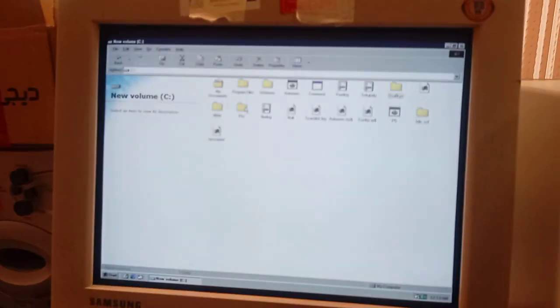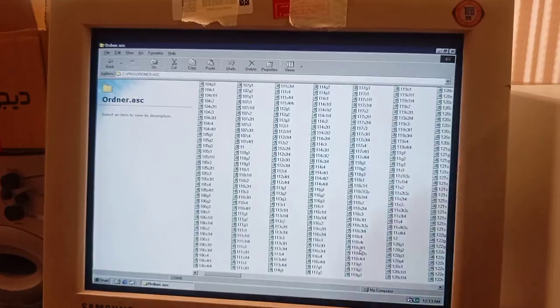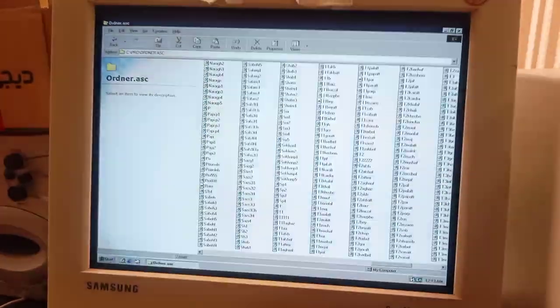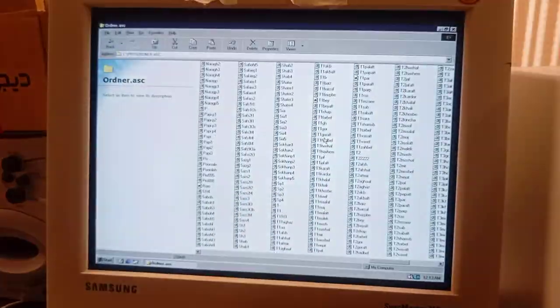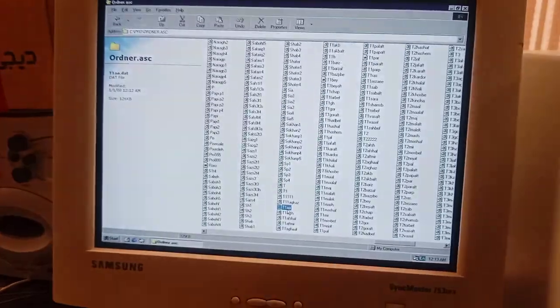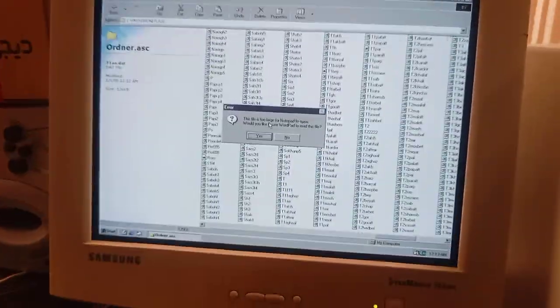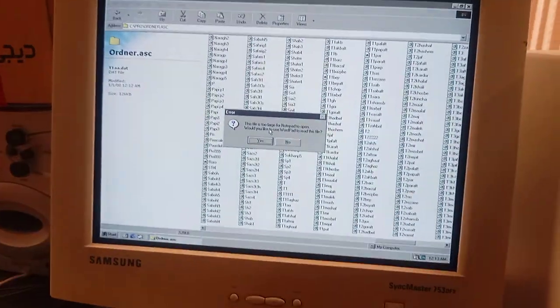And lastly, the trial that we exported, we are going to open that file. It was T something. Yeah, just open it with Excel or any software you have. Okay, Notepad. Yeah, it's good. Open with Notepad just.